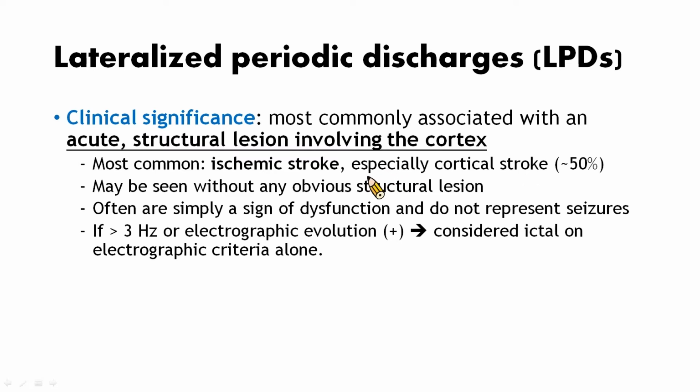It's usually simply a sign of dysfunction and does not represent seizures. That's also the reason why we removed the word epileptiform. But if the frequency is more than 3 Hz, or if there is electrographic evolution, it should be considered ictal on electrographic criteria alone.